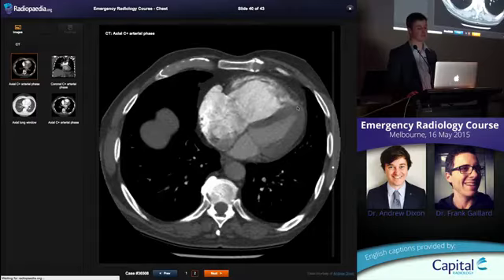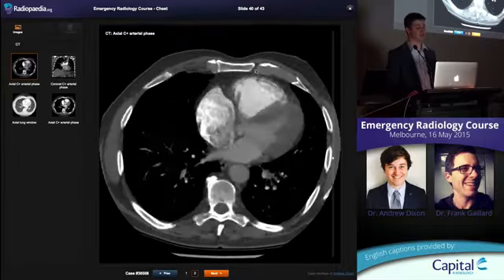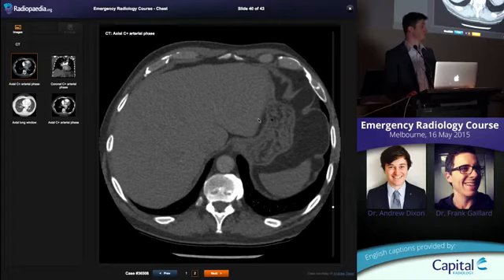If we go to our patient here who has massive bilateral pulmonary emboli, have a look at that interventricular septum. Okay, it's bulging into the left ventricle. There's expansion of that right heart. The right atrium is big, the right ventricle is big. So there's signs of right heart strain on your CTPA. So we'll often report those. You'll also be able to detect that with echo as well.